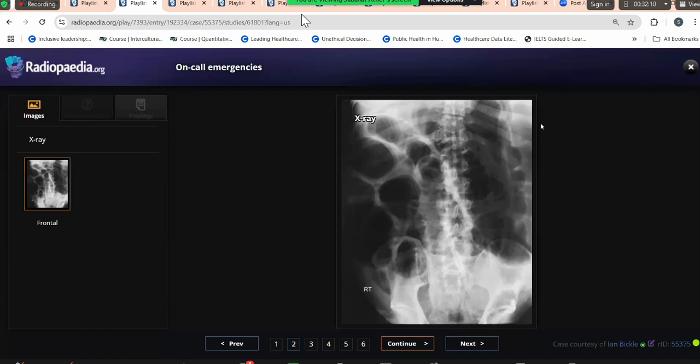Regarding the colon distension, would you like to elaborate this further, please? So I appreciate that there are haustral markings within it. And apart from that, it seems to be arising from the left lower abdomen and extending towards the right. Can you use the cursor and show me which bowel loop you are talking about, please? This one is the large bowel loop. Can you click on your screen once and then show? Yes, now I can see. So what is this part of the colon?